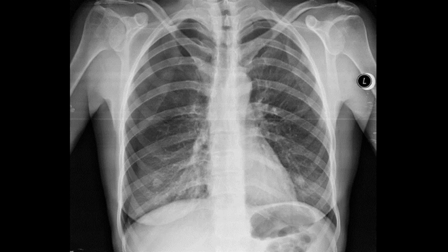The first important thing to see is the lung field. So this is the lung field, and here we have the left lung. The left lung is normally expanded. We don't see anything specific here. Here is the hilum. Here are the borders of the big vessels and the heart. And from the hilum, we see these small whitish streaks, which are actually the vascular markings of the lung, the vasculature of the lung. And they go all the way from the center, from the hilum, all the way to the periphery.